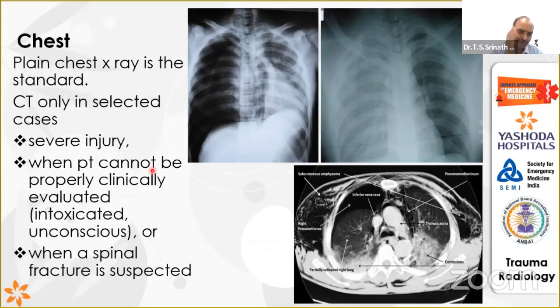So these are the important structures which we all know are in the chest. What other structures are there? That is the extras. You have placed an endotracheal tube. Where should it be? That position is T4, the upper part of your T4.